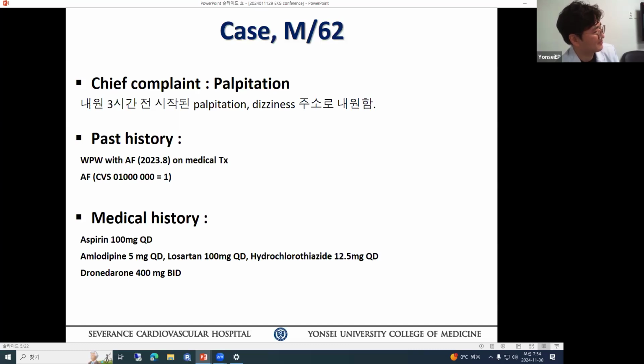So let's step back one step for teaching the fellows. What is the role of atrial fibrillation in a WPW patient during the study? What is the clinical information you can get from that? The first one is that associated atrial fibrillation includes the risk of sudden death. Well, that's a given. The other one is that the accessory pathway perpetuates atrial fibrillation by the mechanism of source-sink mismatch.